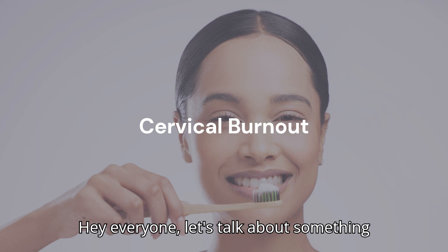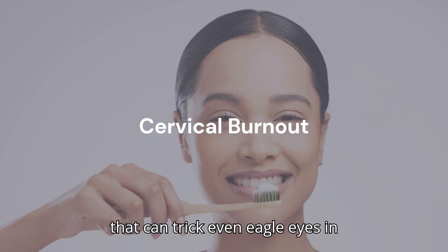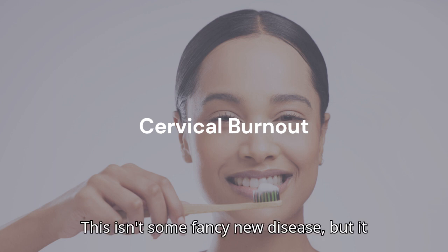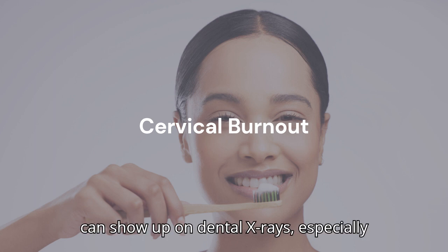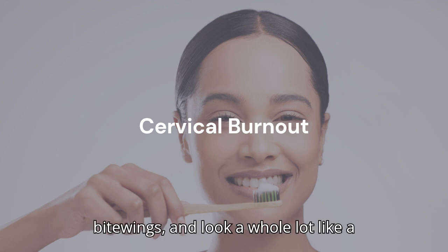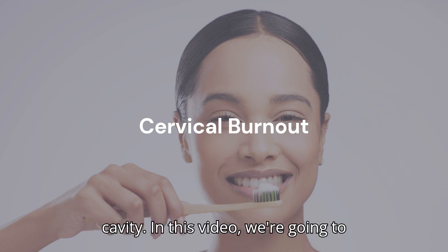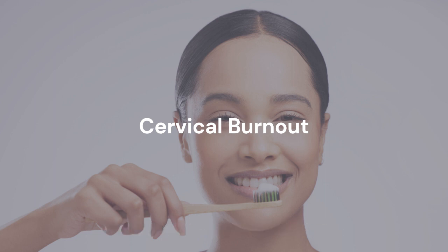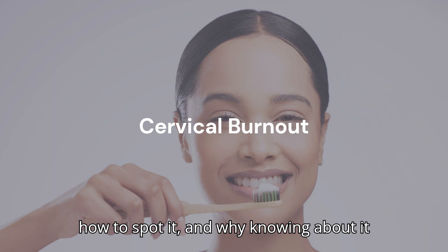Hey everyone, let's talk about something that can trick even eagle eyes in dentistry. Cervical burnout. This isn't some fancy new disease, but it can show up on dental x-rays, especially bite wings, and look a whole lot like a cavity. In this video, we're going to bust open the mystery of cervical burnout, covering what causes it, how to spot it, and why knowing about it matters.